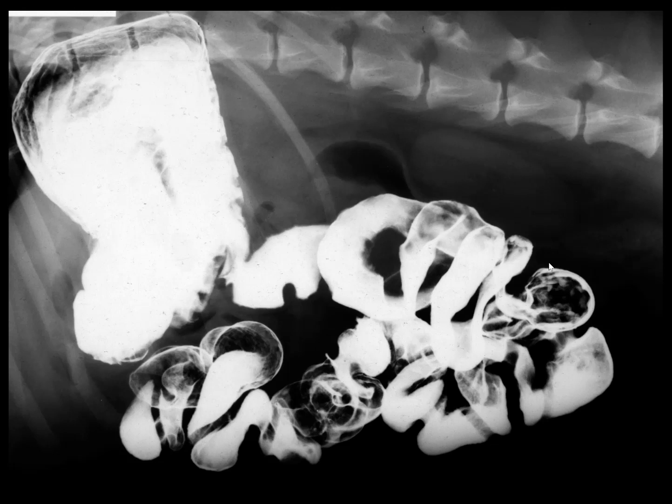And here's what that looks like on an upper GI series, a very bunched small intestine through here, harder to appreciate some of the gas bubbles just because there's uneven filling generally, but a very weird bunched plicated shape here. Here's another example, again, an upper GI series. You can see that there's some degree of distension of the small intestine, so it's not a normal small intestine anywhere, but then you can definitely see the loop that's most affected, or loops that are most affected, where all the intestinal loops are bunched together in this kind of plicated accordion-like structure.